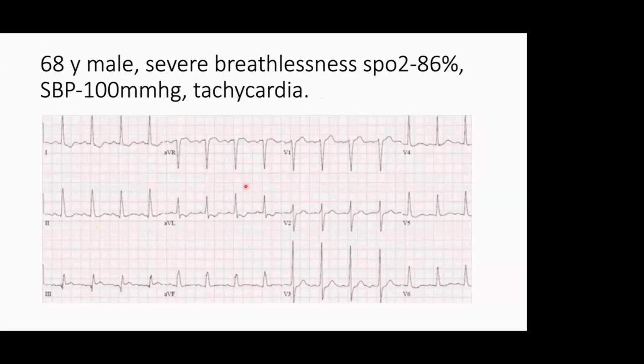Why is there ST elevation in 3? It means the RCA is already occluded, and the right coronary artery is supplied from the left. So the left now has some thrombus and occlusion. The most distal territory supplied by the left collaterals is the RCA territory, so the RCA will be infarcted and will show ST elevation. All the other leads will show a subendocardial ischemia pattern, so all the others will have ST depression. AVR will have ST elevation.